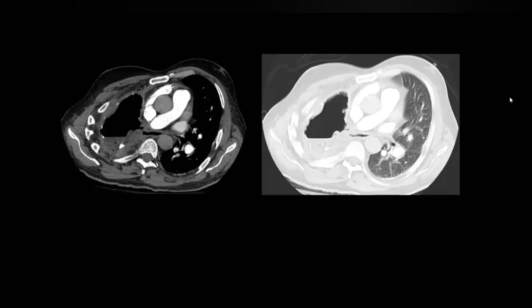In all the scenarios we considered, even bronchoscopy was done. There was no bronchopleural fistula. There was no history of insertion of a tube, etc. So now, any other possibility that causes the presence of air in the pleura? You mentioned the esophagus. Do you think there could be an abnormality in the esophagus? There may be an abnormal communication with the esophagus. So how to confirm this?